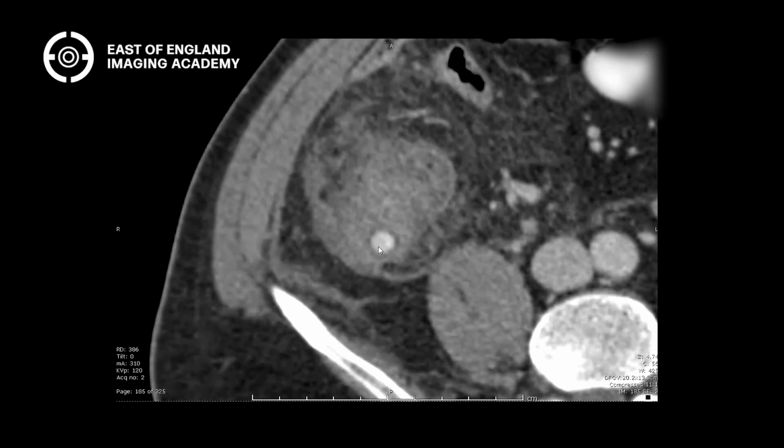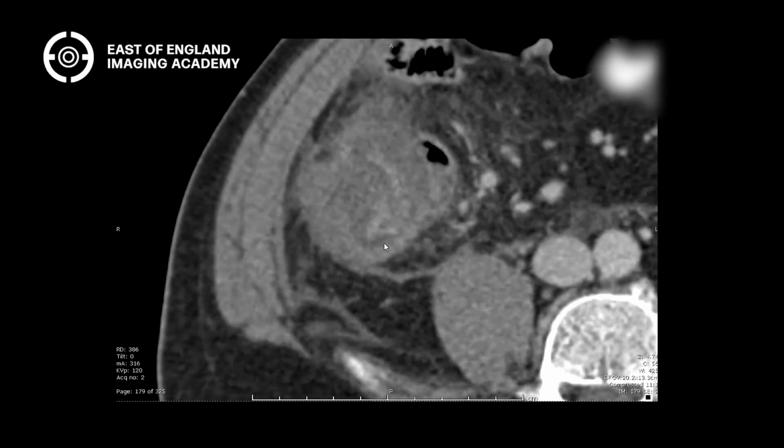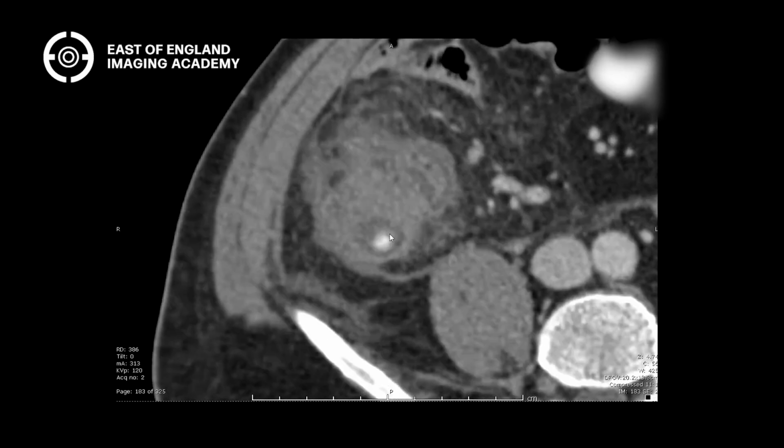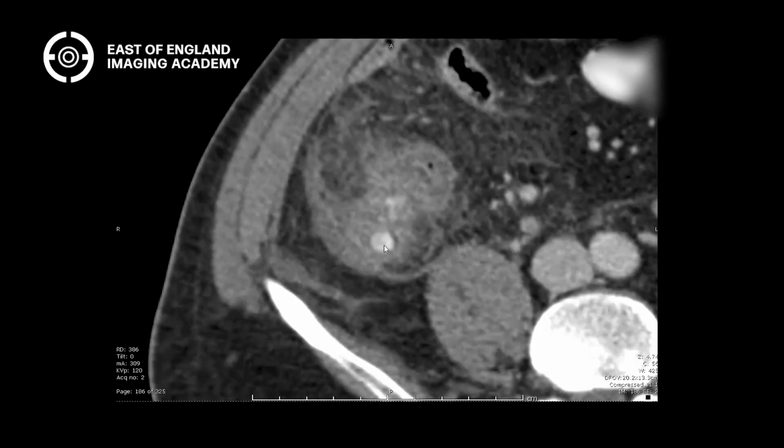And what's this? Exactly. So that's a fecalith in the appendix, we call that an appendicolith. And you can see that's right at the base of the cecum, at the cecal pole. So this is the cecum here, right at the cecal pole. At the base of the appendix, you've got that appendicolith that's stuck there. So that's the cause of the appendicitis, right?